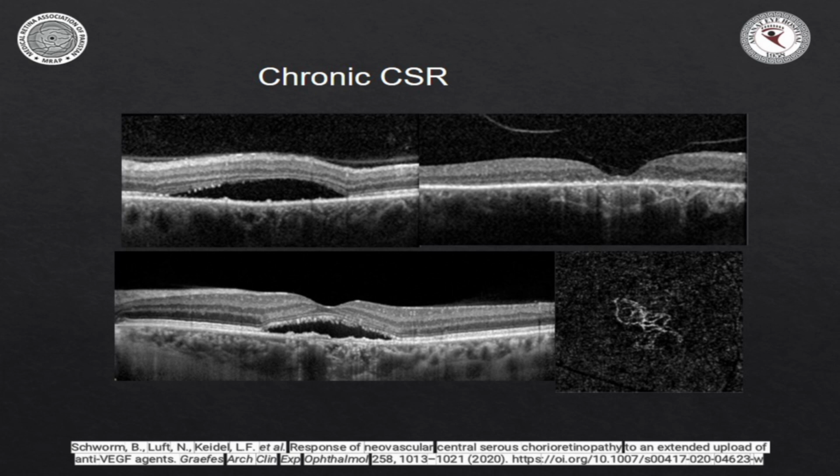Patient presents with low vision, and you get this picture. There's no sign of a CSR. This usually happens when he's got one good eye, and he's been neglecting the CSR in the other eye. वो आता रहता है और जाता रहता है, and eventually you find that there's a foveal atrophy, and there's no other sign of CSR at present. उसमें if you do a fluorescein angiography, autofluorescence, you will find that this very zone will correspond to the site of the CSR and it will be hyper-autofluorescent. So that is another sort of presentation altogether कि multimodal imaging को कैसे एक दूसरे के साथ net करना है. But for the purposes of this presentation, I was focusing basically on CSR.